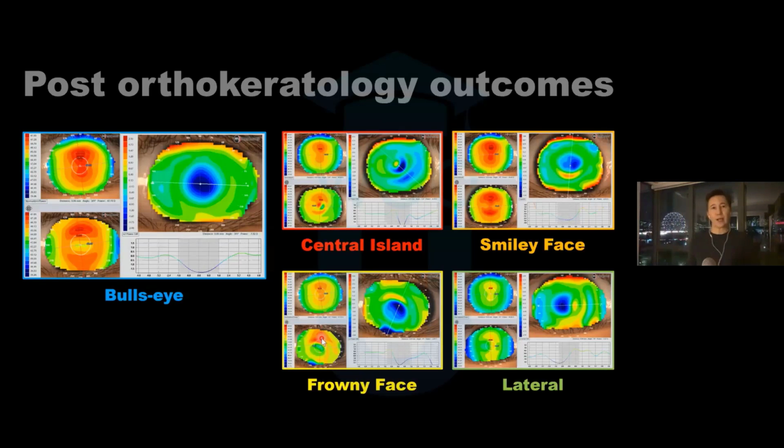So these topographical outcomes, remember, subtractive outcomes, really guide what our assessment is of orthokeratology. Do we need modifications? Can we make improvements? We need to use the subtractive map. Once we get that, then you can understand, have I created optimal myopia control for this patient?